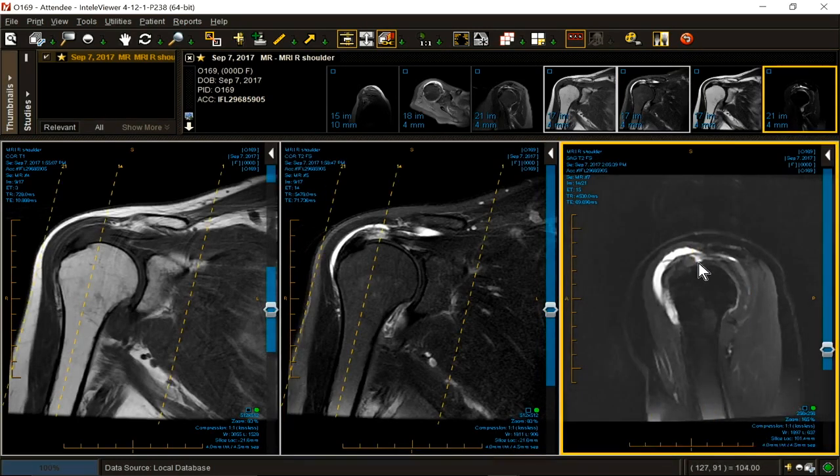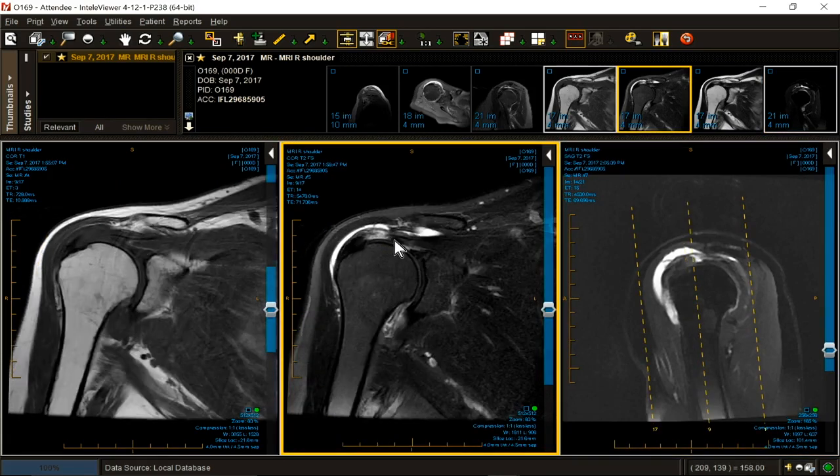It's deep, it's penetrating, it's fairly broad. I'm going to describe it as medial to the footprint, in the cable portion of the cuff, a full or near full thickness, penetrating tear involving no less than 80 to 90% of the cuff depth, X by X centimeters, period.